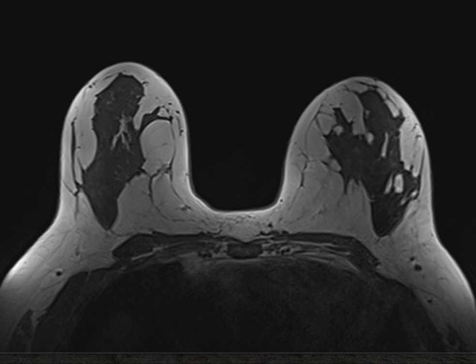Different institutions do different things, but I will just go through what University of Illinois in Chicago does, because that's what I'm used to. So I don't look at the history. I look at all the images first, so I try not to bias myself into what I'm seeing. I will look at the scouts to make sure there's nothing else on there outside of the breast that I'm not paying attention to.